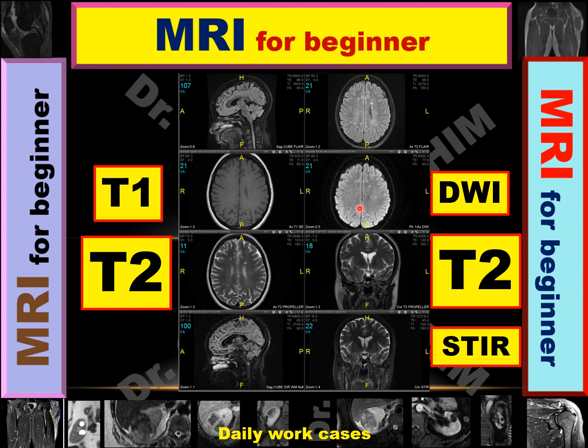If this hazy outline does not appear like this, but appears clear, and more details appear like this also and like this, so all these are FLAIR sequences. In the FLAIR sequence, CSF appeared dark, white matter darker than gray matter, and the details appeared clear.